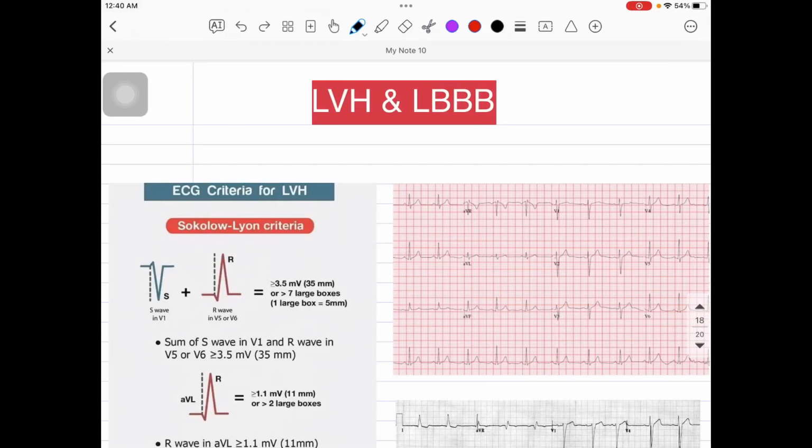So today in this particular session we'll try to find out how to identify LVH and LBBB. That is, LVH means left ventricular hypertrophy and LBBB means left bundle branch block. How to identify, how to find out in an ECG of any person. So that will be the motto of this video.